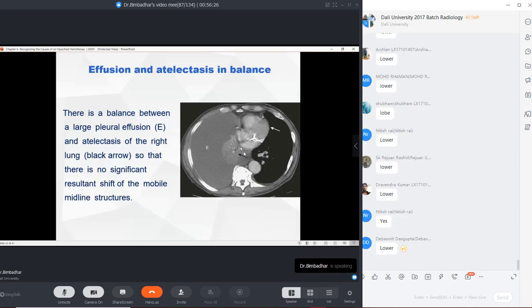The person is in supine position, with fluid filling, but you cannot differentiate the fluid filling here because the complete lung has been filled up, and fluid density will look hypodense in the mediastinal window. Okay, this is the mediastinal window. Don't ask, if it is an opacified hemithorax, why is it looking black? It is not looking black, it is looking gray, which means on CT, in lung window, it will be completely white. The window I am looking at here is the mediastinal mode because the heart structures are also looking gray. This is not lung window.